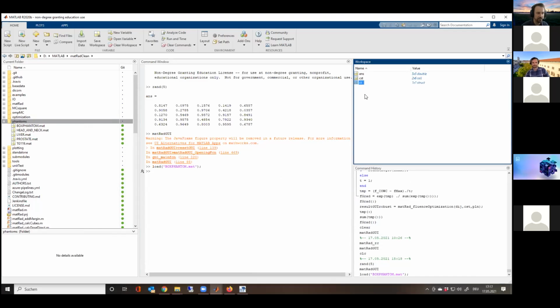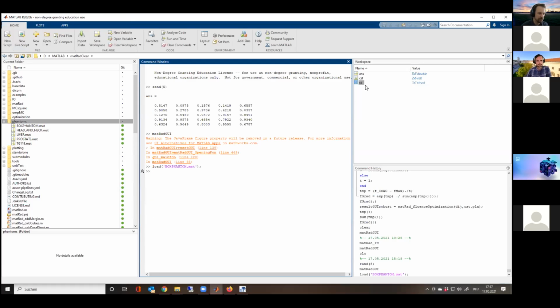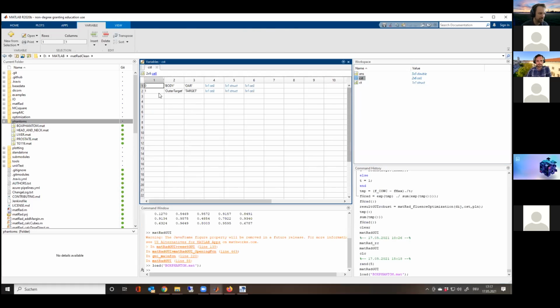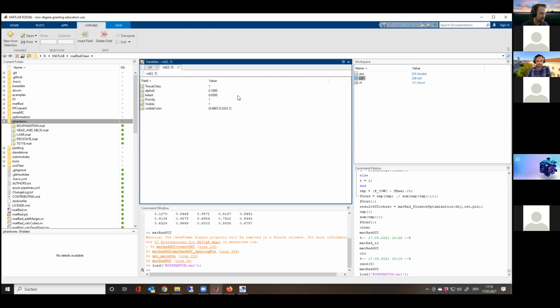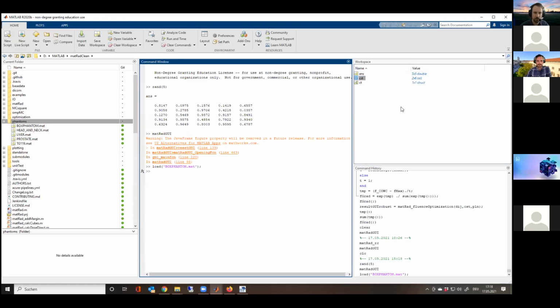So that's the CT. That's the CT representation. It contains a Hounsfield unit cube and some dimensionality info. So that's basically just representing the data in a very simple format in MATLAB. There is the CST, which basically contains structure information. In particular, it contains some settings for display and biology, and also the list, the binary mask. So we will come to this in more detail. But this just loads the patient.